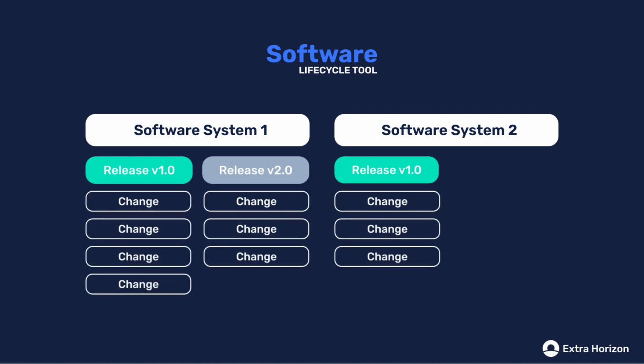Changes are bodies of work. It's important to note that in order for a release of a software system to go live, each change needs to be verified. Verified means that all the checks or all the requirements of the 62304 standard are completed.